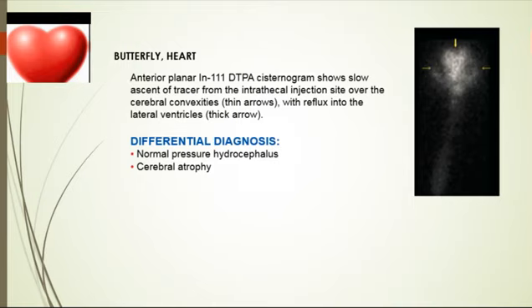Radionuclear. So now it's the cerebral CSF spaces. We inject the contrast intrathecally. You just see it's a lumbar puncture. You see the CSF flowing wherever. Okay, the radionuclide cisternography uses intrathecal injection of a radio-labeled pharmaceutical. Usually it's indium-111 DTPA.